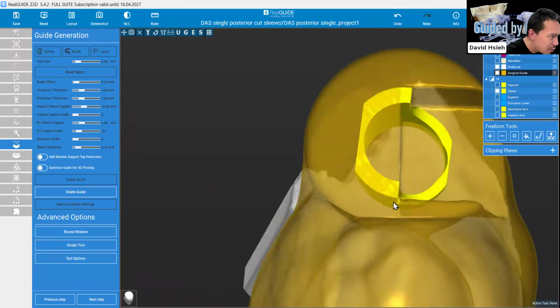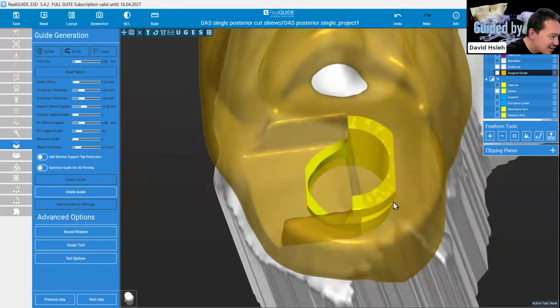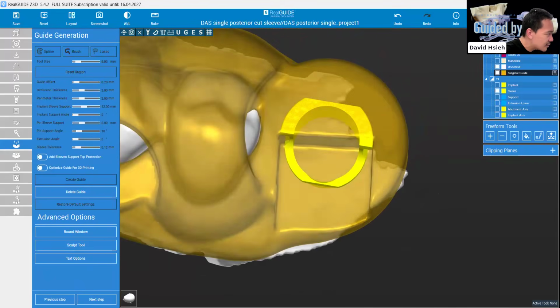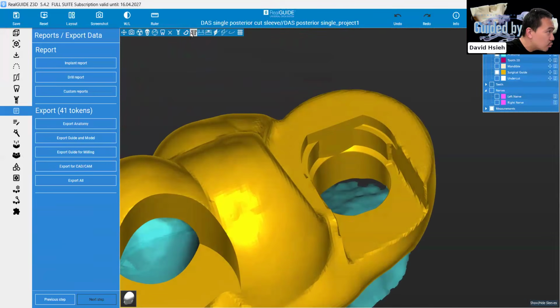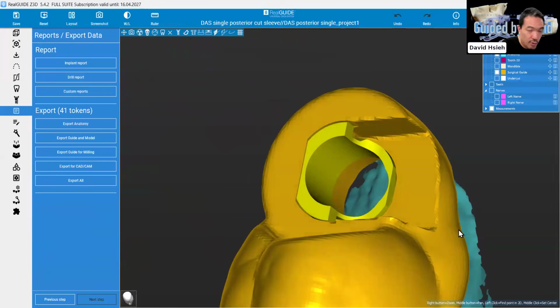And now, voila, you just opened a side opening. That's easier for the guided sleeve to fit in. So yeah, this is basically how to cut more on the side. As you can see here, now you have even more clearance, rather than a slope right there.